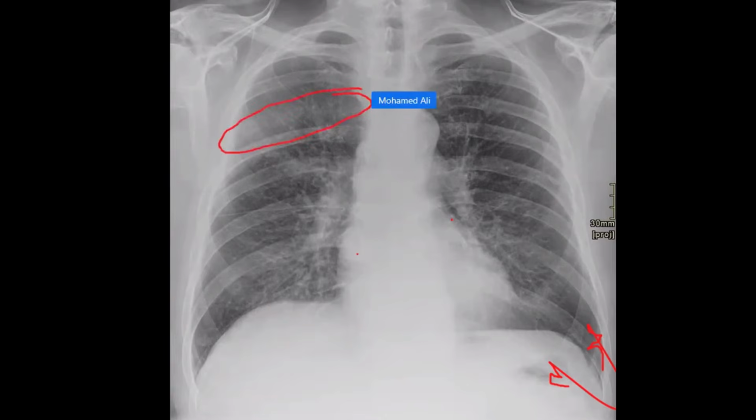And second would be if there is any history of prior resection. Yeah, you're right. We would like to highlight to check the bony cage perfectly in any case. We have a lytic metastatic lesion involving the posterior aspect of the right fifth rib. And we don't really have in this chest X-ray any sign of a primary malignant mass that can explain this metastatic lesion. But all the time you should check the chest wall.